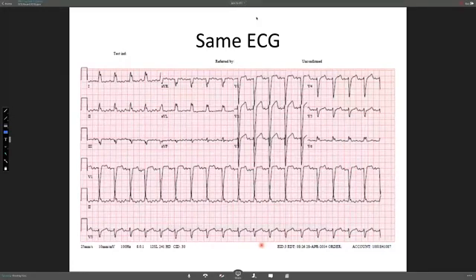Any comments, Fathi, from you? No, I think I would like to add something. Just looking at the EKG, since it's in the limb leads, it could be tremors. But in the precordial leads, you don't see anything. It's nice sinus rhythm. So my interpretation is that this could be some tremors, because it's mostly in the limb leads. Yeah, that makes sense.